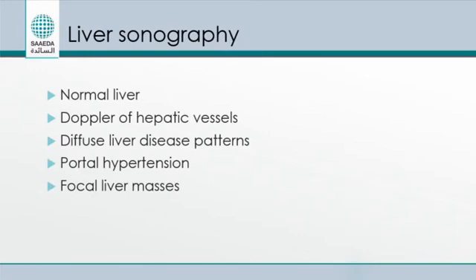Today we are going to cover the following topics. First, the normal liver and the Doppler of hepatic vessels, including the portal veins, of course, diffuse liver disease patterns, portal hypertension, and focal liver masses.